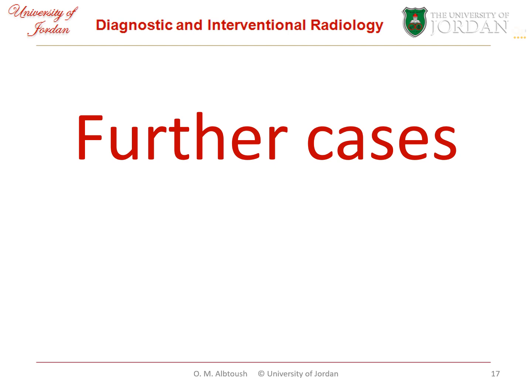You need to worry a lot when you describe a fracture. You need to think always about whether there is any underlying lytic or osteoblastic mass, and you don't need only to mention the fracture or describe where it reaches, for example, if it has an intra-articular extension, or if it's comminuted or non-comminuted, displaced or non-displaced, complete or partial. The most important thing is to say whether there is any underlying process, so whether it's a pathological fracture versus a traumatic or benign fracture with no underlying cause. This is very important.